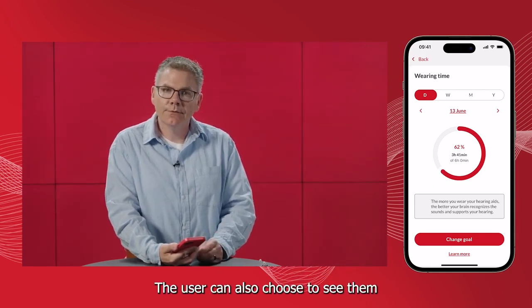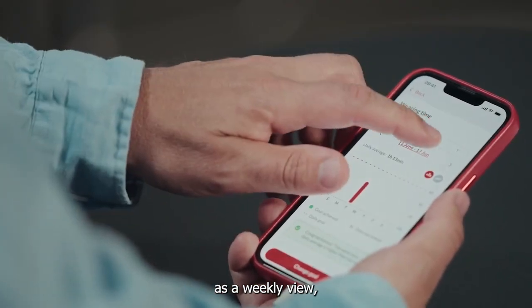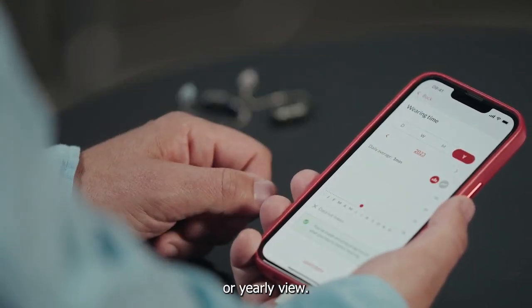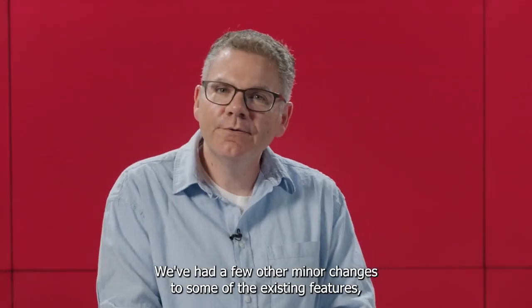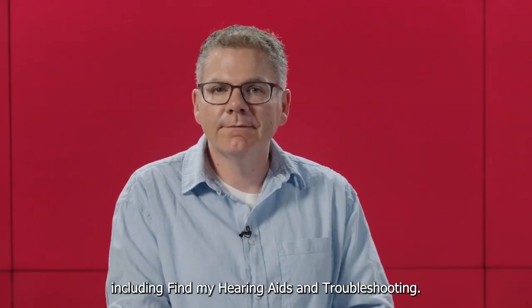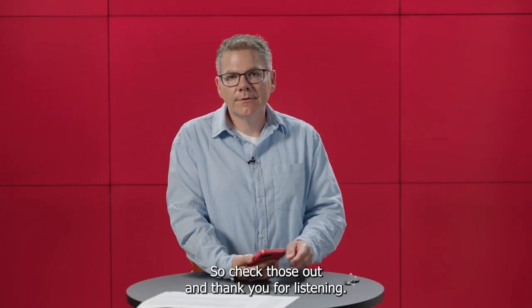The user can also choose to see them as a weekly view, monthly view, or yearly view. We've had a few other minor changes to some of the existing features, including Find My Hearing Aids and troubleshooting. So check those out.